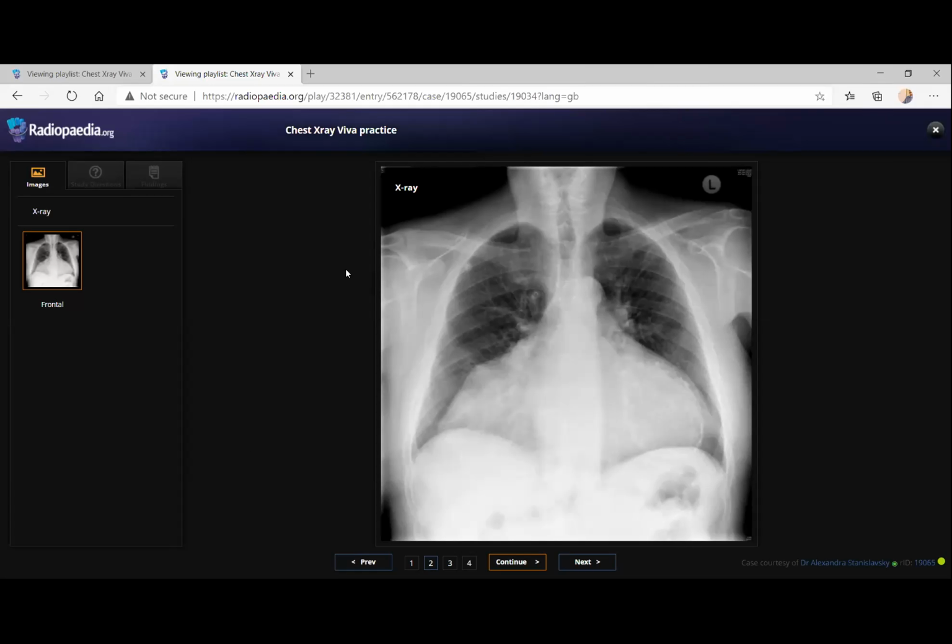Followed for a post-operative. Post-operative, but I'm not able to see. Okay. I can see that there are sternotomy sutures, if I can see well. So this patient might have gone for a cardiac surgery before, and this is why he's having this abnormal cardiac configuration. For example, he could have. I'm not sure actually. Maybe cardiac transplant or something. I'm not sure. Yes. Okay.